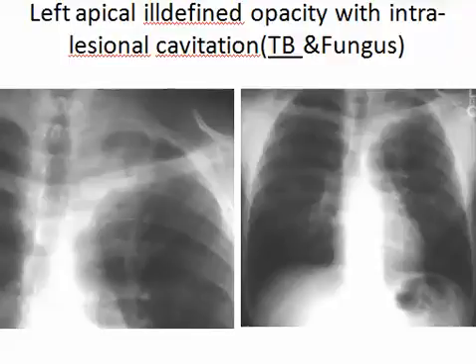And this one is left apical opacity, as we said before, which can be diagnosed as a Pancoast tumor, yet a long history with signs of chronicity and signs of left hilar strandy opacities. That means there are satellites with cavitation, which is usually with tuberculosis and fungus.